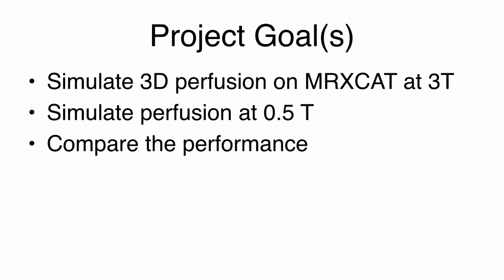There are three aims of this project. First is to simulate 3D perfusion on MRXCAT at high field, 3 Tesla, and then simulate perfusion at low field, around 0.5 Tesla, and then compare their performance.